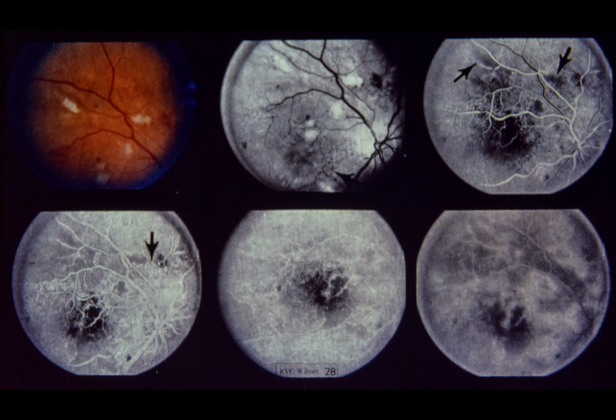Extensive capillary closure in the diabetic patient is often the harbinger of proliferative retinopathy. In fact, 2 months after these photographs were taken, this patient was found to have developed retinal neovascularization from areas of capillary closure. Slide 29. Pathogenesis of proliferative retinopathy. We have done serial fluorescein angiograms in diabetic patients prior to the development of proliferative retinopathy.